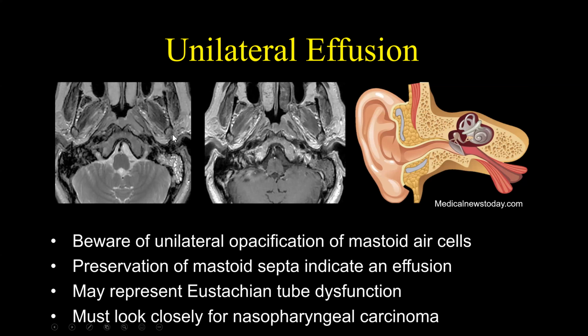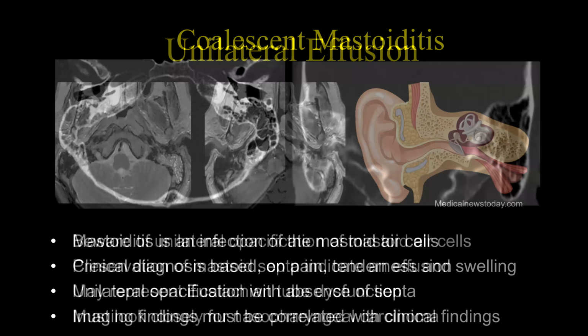So specifically what we're looking for are unilateral nasopharyngeal carcinomas. And remember, there are lots of causes for headaches, but one of the causes for headaches is mastoid effusions due to occult nasopharyngeal carcinoma. So one of those little checkpoints is to always mention this in your dictation if you see it, and then make sure your eye looks at the fossa of Rosenmuller.